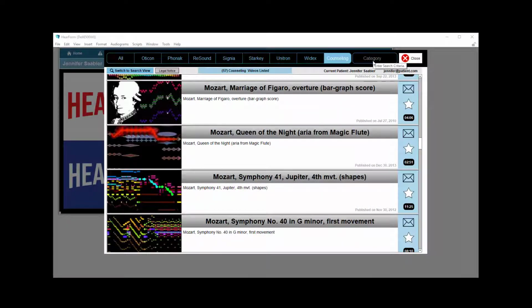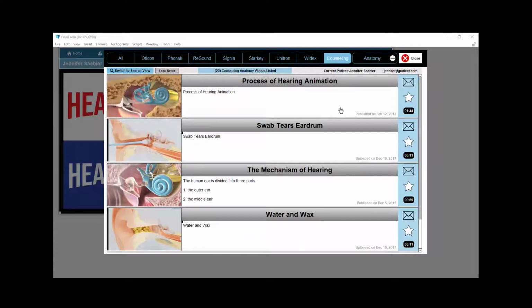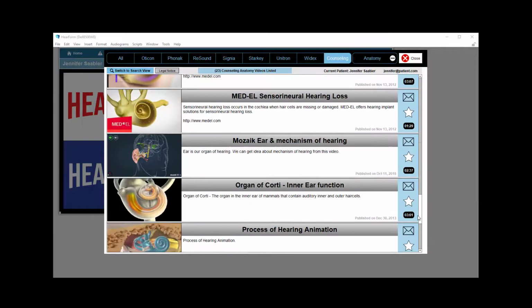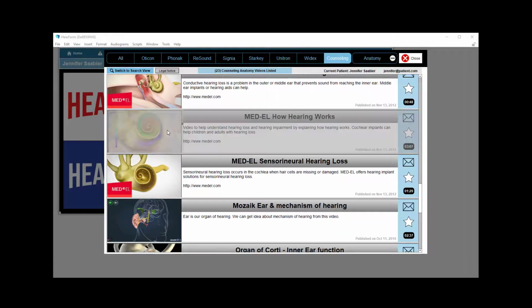Or you may just say, I want to look at some of the anatomy videos, pediatric, whatever they are, and it will isolate those, the proper way perhaps to use an ear swab, or just, again, the mechanics of hearing. There's just some really nice videos that are in here. I happen to like this Med-L one, very nice.